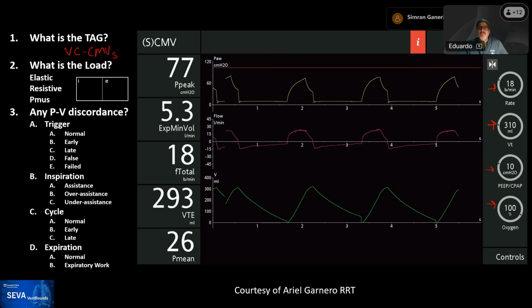All right, let's see some entries coming in. So let's start with the initial part. So this is a square waveform, and you obviously don't see a beautiful square waveform, but you see a step up here. But the key here is, because you cannot read very nicely, you don't see the initial step up here, and you see this all curved. You may be a little bit confused.